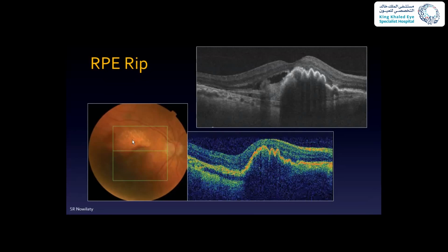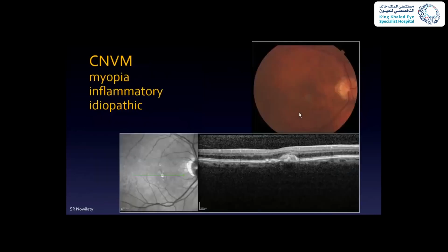If you do a picture, sometimes it's associated with blood, and usually with an acute vision loss. And here it is. This is typical of an RPE rip, when you have this zigzaggy appearance followed by a loss of the RPE.